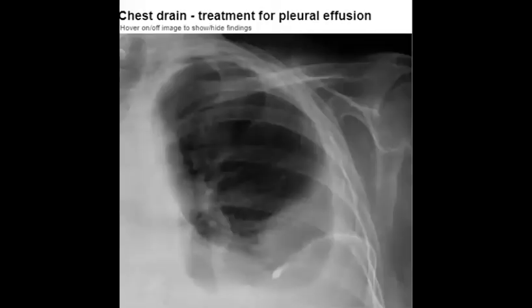And this one, if it is in low position, as Ala mentioned, it will be... Zoom user, we mentioned that the catheter, like the PICC, which is used for long-term therapy, will be in the cavo-atrial junction. Okay.